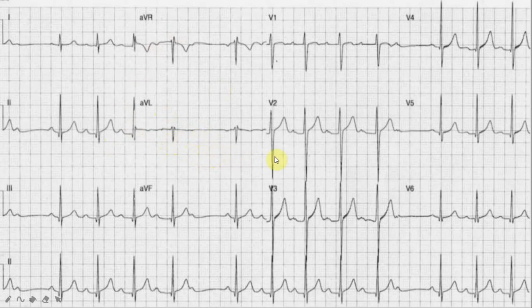Thank you very much. That was an absolutely brilliant interpretation. Now, a couple of things we need to consider here. First of all, this is correct: there is a P wave followed by a QRS complex, repeated four times, and the fifth P wave is followed by no QRS complex. So this is a 5:4 Mobitz type 1 second-degree heart block. If you look carefully, the PR interval is progressively prolonged, which can be appreciated by comparing the PR interval in the first cycle and the fourth cycle.